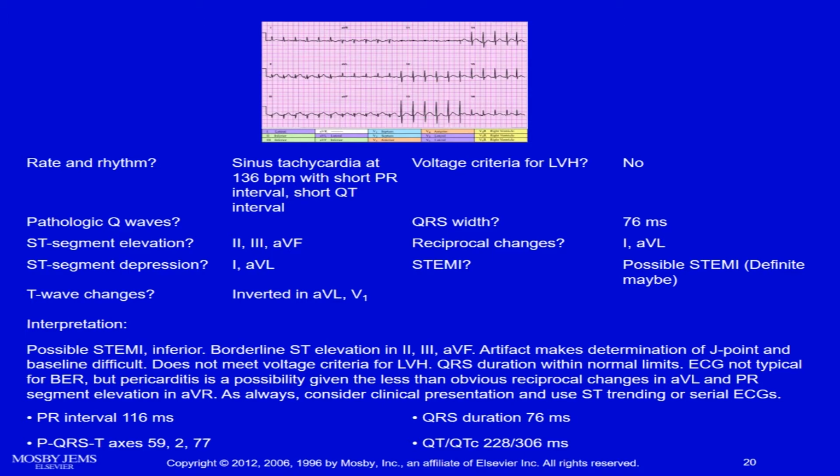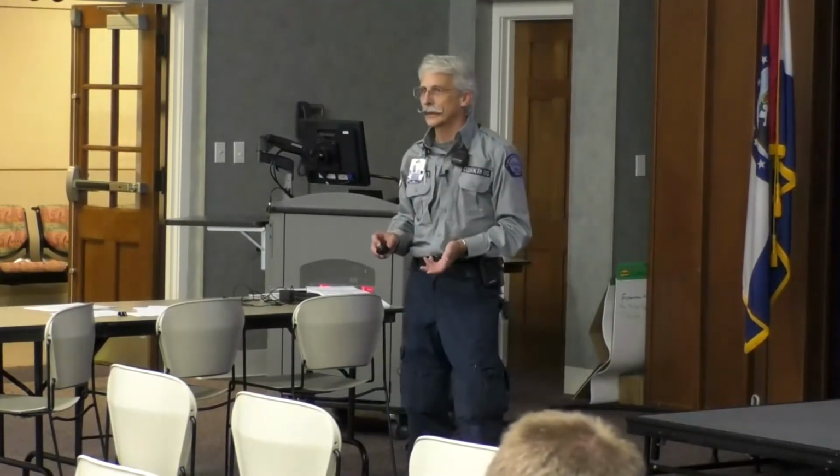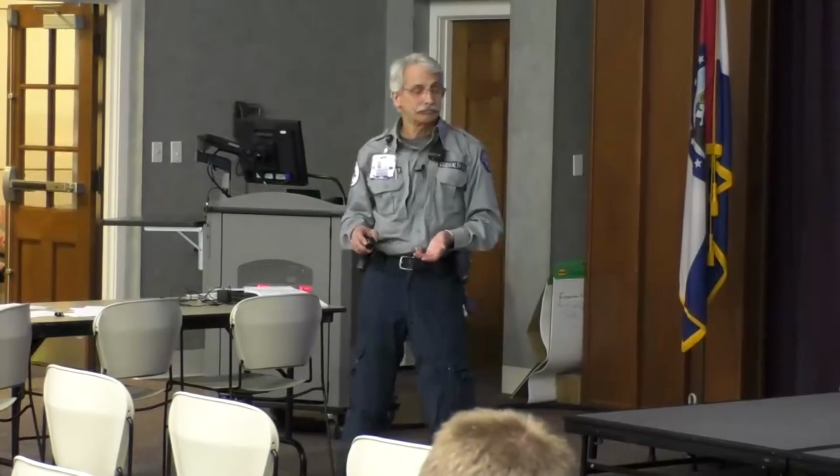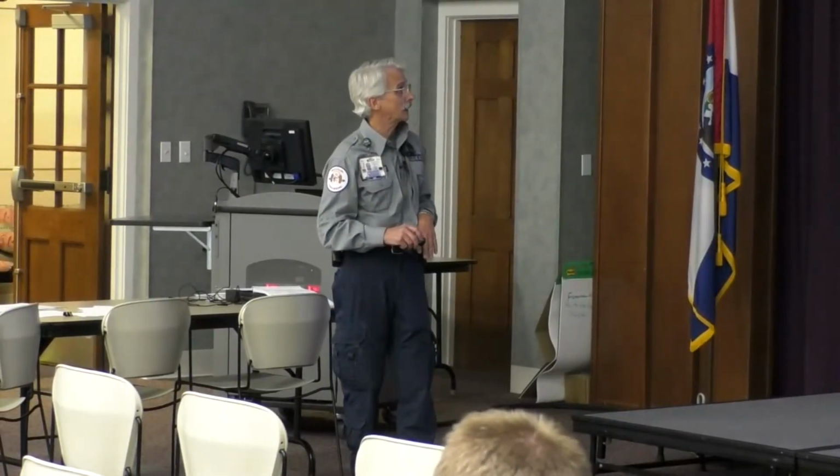Are they going up, or are they coming down? Part of that, we can go back and look at the T waves, and they're kind of down, so it may not be early. Pretty good to say if you're getting called to the scene, it's going up. When did your chest pain start? When did you start feeling funny? All right, but we're going to call it that.